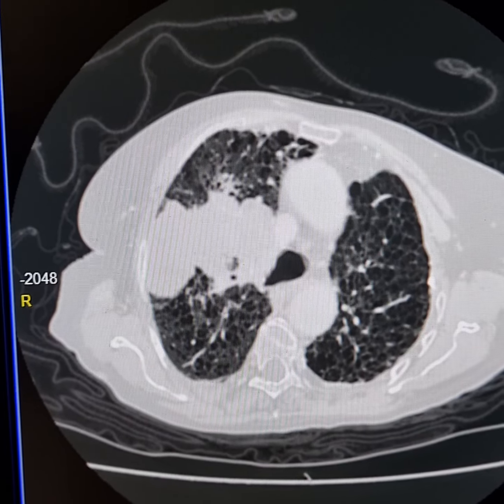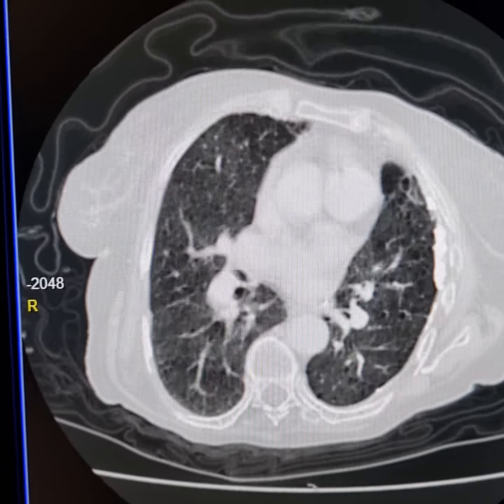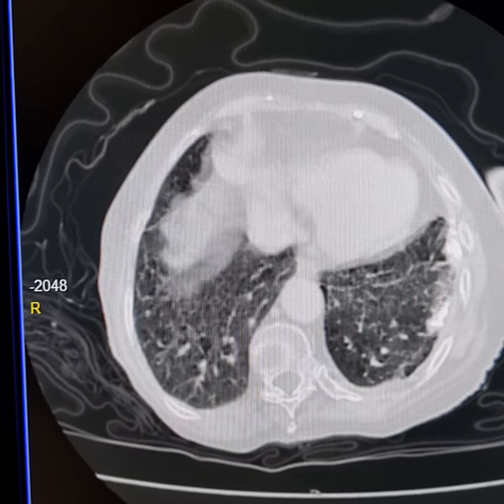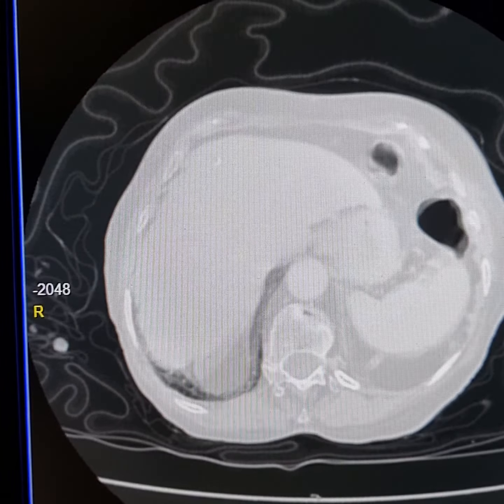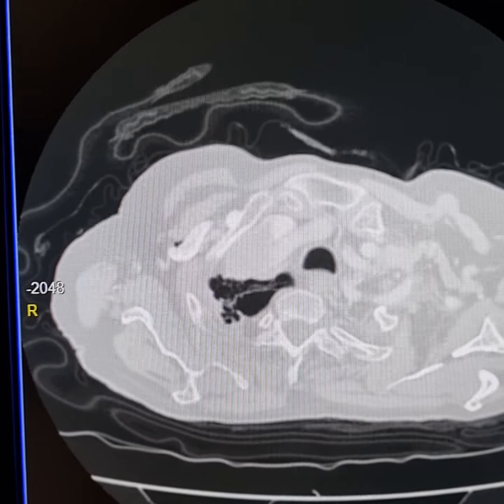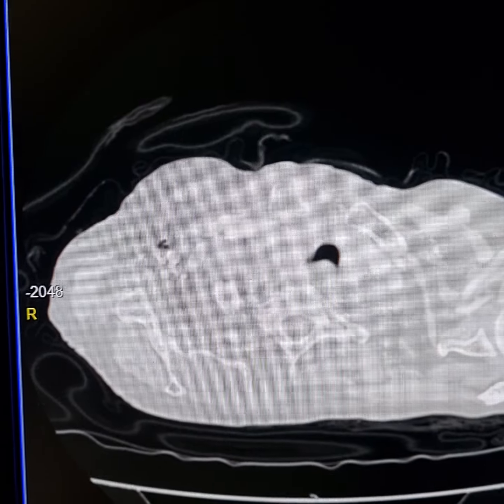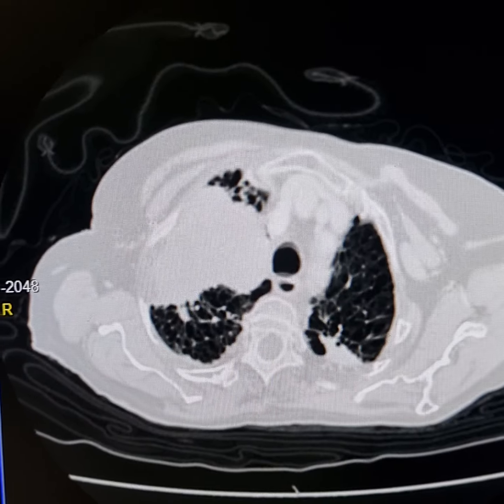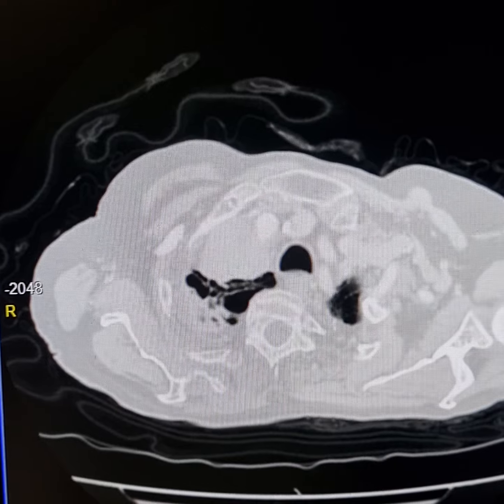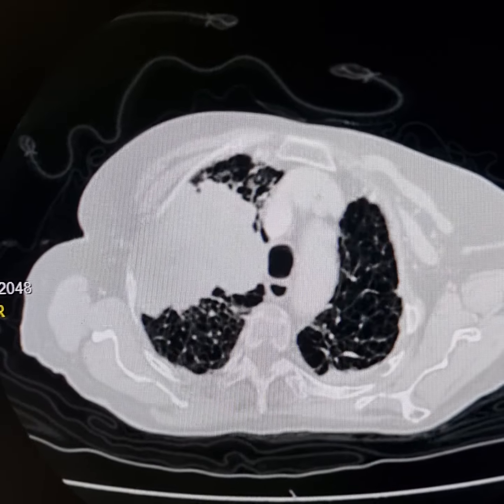First, I will show you the general morphology of the mass and the lungs, and then I will focus upon the other pathologies. I go back up again. Nodulostriate lesions are present in both the apices. These are suggestive of previous Koch's infection.